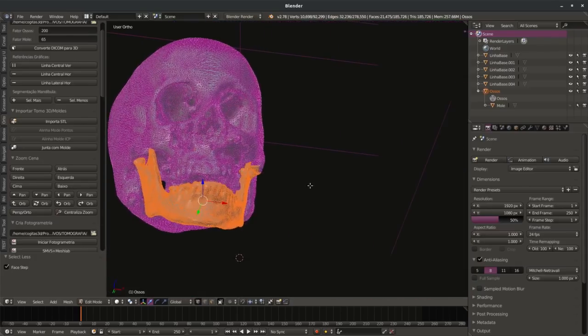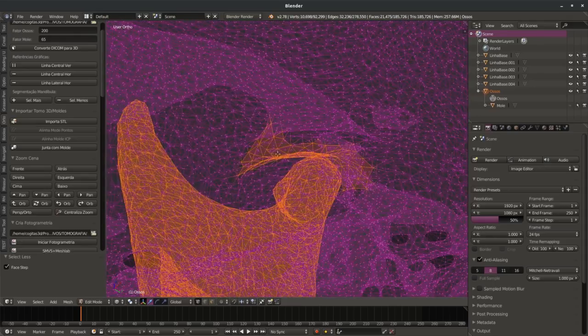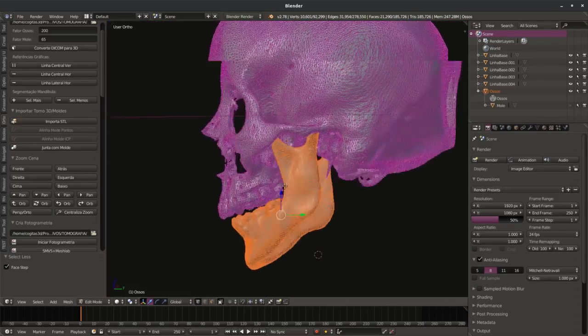Okay, and on the other side I only put Z to wireframe. I press C, I put the selection region bigger, rotating the scroll down, and I click in the scroll and deselect the part we used.